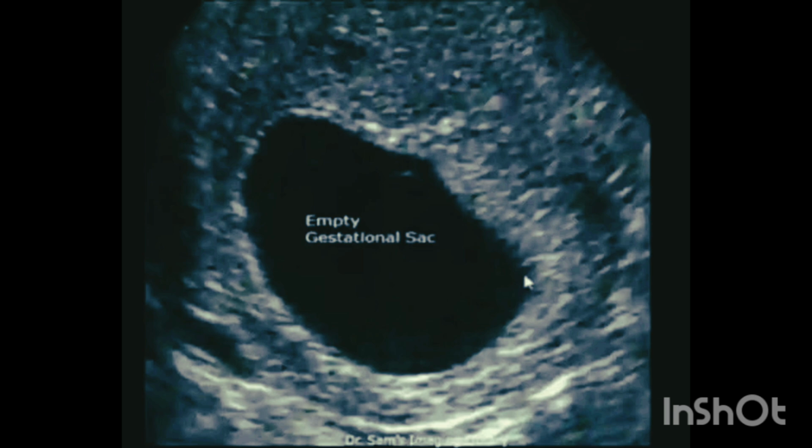In this image, you can see a gestational sac of greater than 25 millimeters with no embryo. This is also called a blighted ovum or an anembryonic pregnancy.